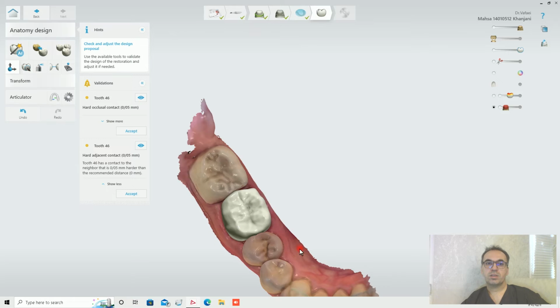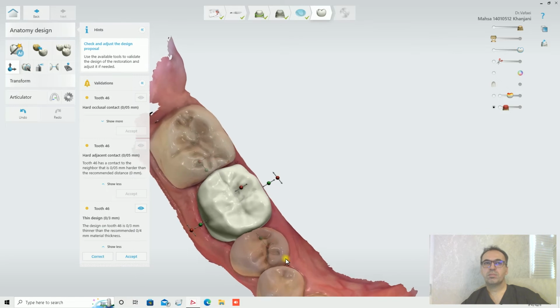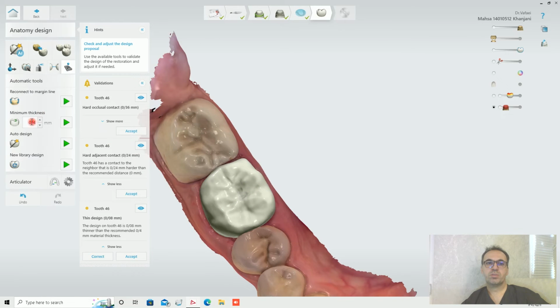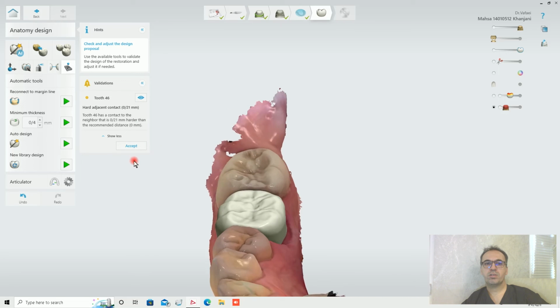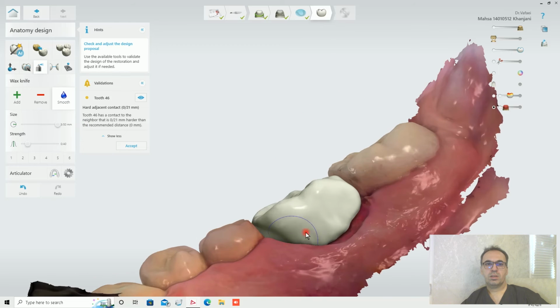You can trust the software to do many simple cases. And of course, in future years, maybe you can do this with complex cases. But right now, I think in single units, you can trust the software and calculations.